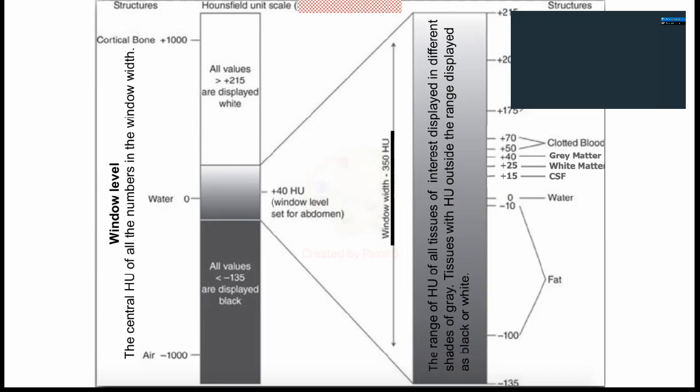This is a quick review again. I can't emphasize enough how important it is to know the basic radiographic densities and the Hounsfield figures. The Hounsfield scale is a measure of densities from -1000 at the least dense structures to +1000 at the most dense structures. By convention, 0 is water and -1000 is air.